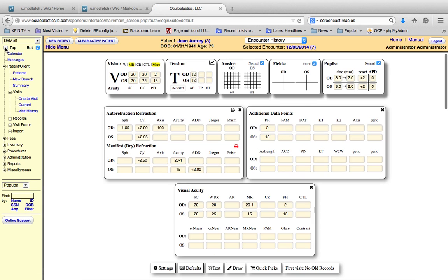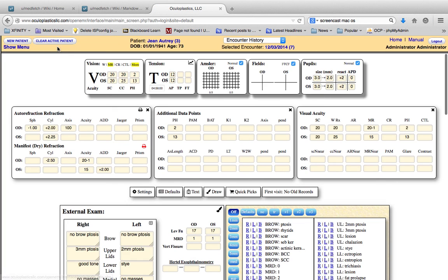Let's look at this first patient, and this is the guts of the eye exam, and it opens up with all of your predetermined preferences. As you work on the form, adding patient data, the iMag form learns what your preferences are. Although there is a settings area here, it's empty, there's nothing there yet.